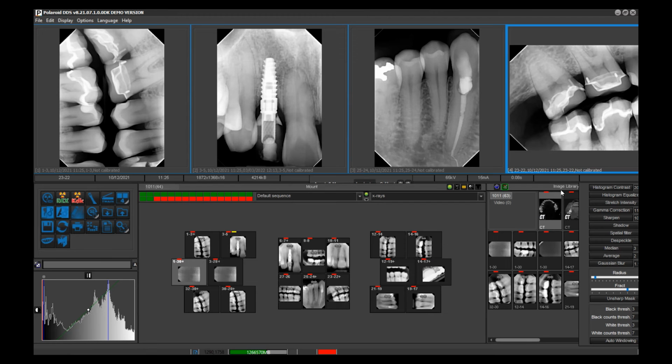Say you did a nice case, you know, an ortho case or a veneer case or something. You can ask the patient, can we use your pictures? And if they say yes, you go through, you mark it, you select those images, it removes all the patient information and it puts them in a separate library. Now you can create your own before and after library of images that you've created. In the past, people used to buy libraries from David Hornbrook, Ross Nash, you know, and pay them thousands of dollars, but they can never recreate the quality of the smile or the work. This way, you can keep a running history of your own before and afters, and use that to help.